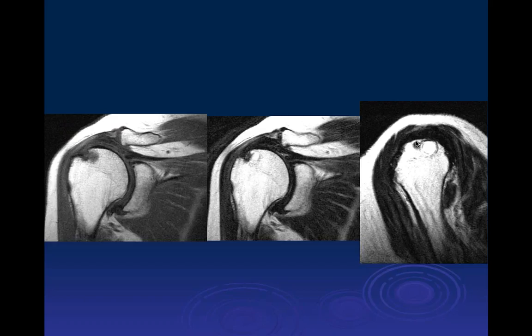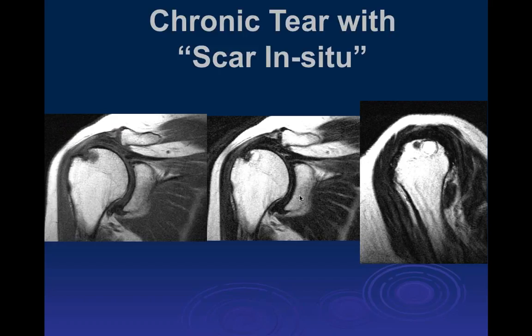So this could potentially have been a patient who had an arthrogram and it could have been an abnormal concentration of the gadolinium. If it's too strong, yep. That's not the case here. Otherwise it could just be scarring, or it could be amyloid, dark signal. Right. With amyloid, we'd expect more diffuse thickening of the capsule and erosions, with amyloid deposits really out around it.